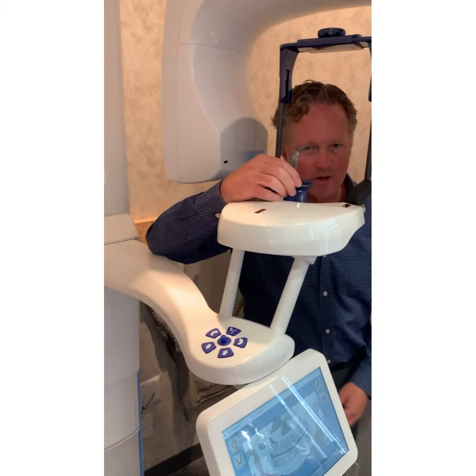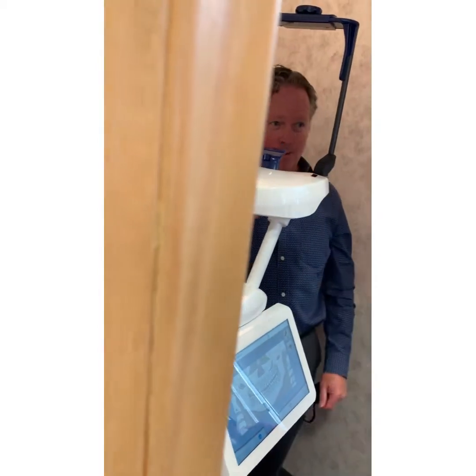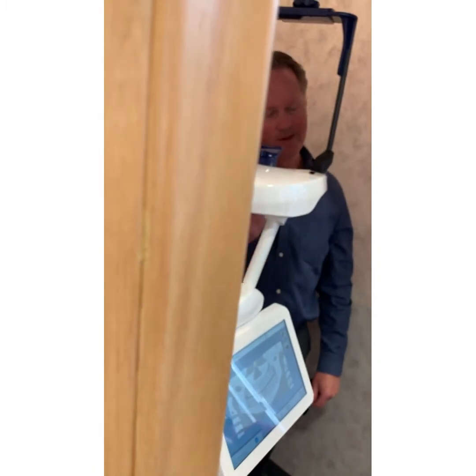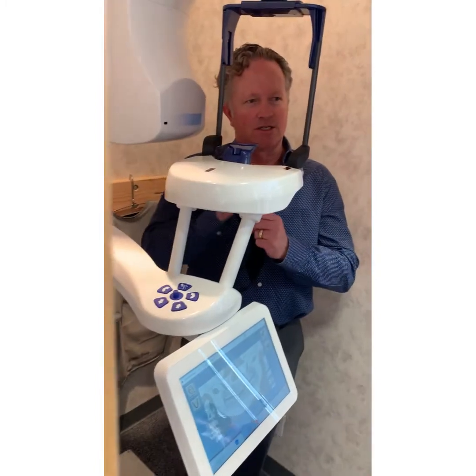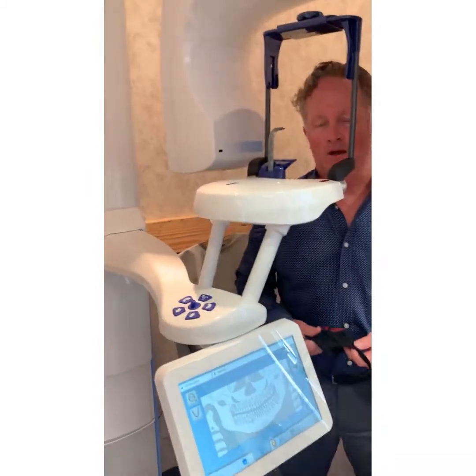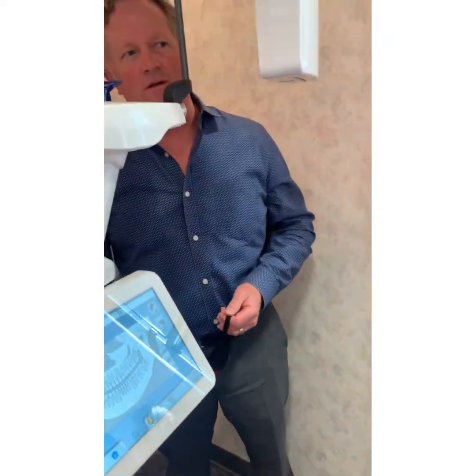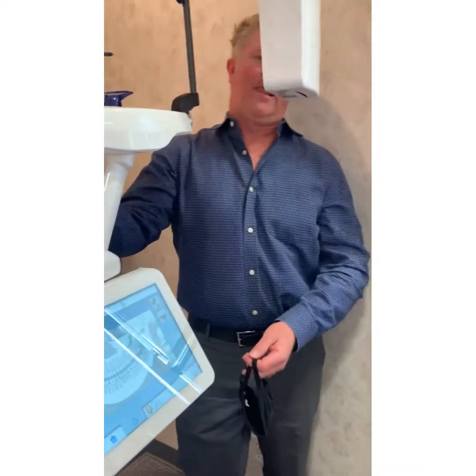Depending on what your aseptic sensibilities are these days, you can tear this pouch open every time a patient comes up, so they know it's sterile. But most offices just use a sleeve, depending on the flow of the office and how many patients. Do we need to buy those, or did they come in the box? You use the little green condom, finger dots, all of those things work. We have those for the sensors.